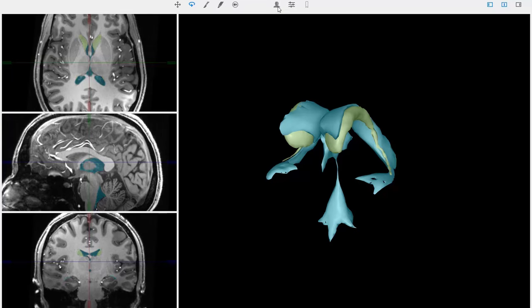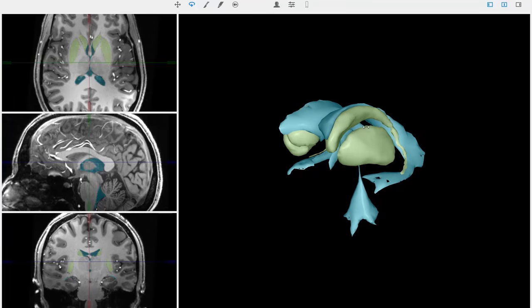The next structure is the putamen. I'm highlighting the putamen in green as well, because in reality the putamen and the caudate start out as one structure. They're separated by the internal capsule, which is white matter that splits them apart. As they're split, there's little striations here, and so together the putamen and the caudate are called the striatum. When you hear that in the clinic, somebody talking about the striatum, they're referring to the caudate plus the putamen.